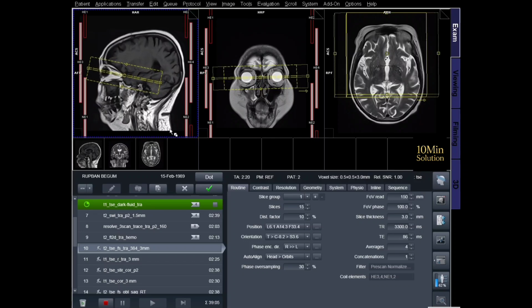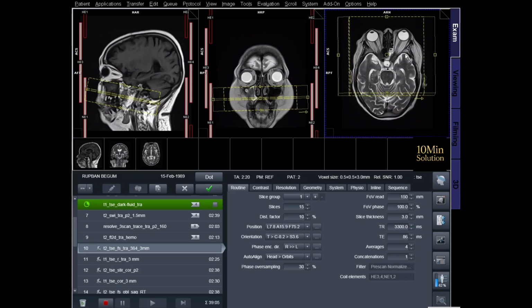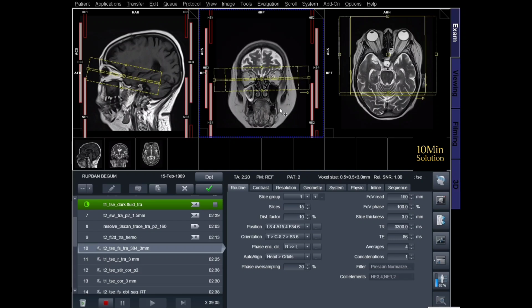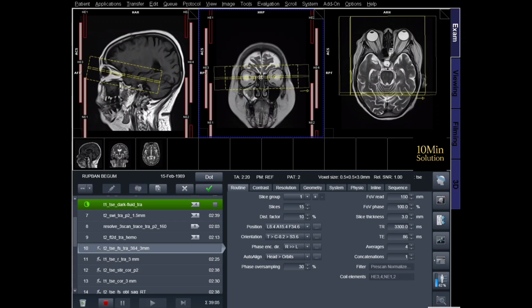In this video, we will discuss the MRI of Orbit planning protocol. MRI of Orbit is a highly important imaging procedure used to evaluate the eye globe, optic nerve, extraocular muscles, lacrimal gland, orbital fat, and surrounding soft tissues.